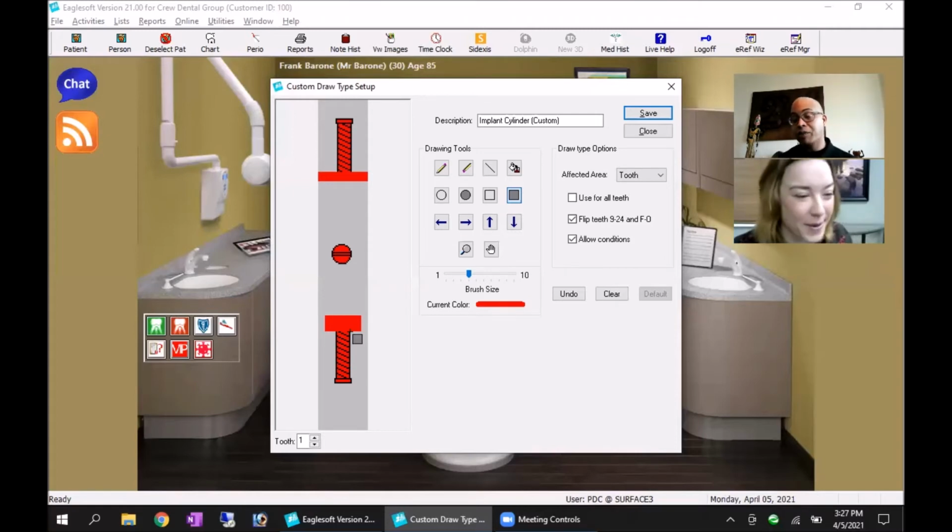And you just, again, goes back to sequencing. I have to make sure that implant is there first. And then now this new implant drawing with the block on it goes on top of it. So that one now has the locator on it. And then I could put a crown on that or whatever, and now I've got a couple of different levels of information there. But sequencing is the important thing. Because if I put a denture on top of this, it's gone, no matter what. But if I put the denture in first, now I'm good.